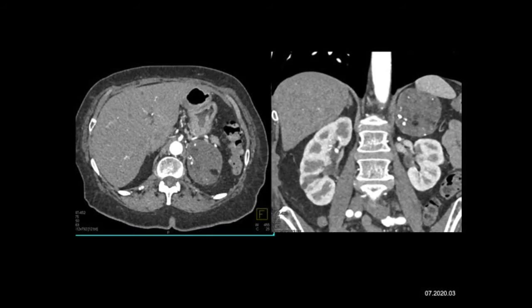They're low density. Adenomas typically are under 10 Hounsfield units and can be minus 10, but they don't have solid fat. That's what we see with myelolipomas. Yes, I know that occasionally metastasis, pheochromocytoma, or a primary adrenal cortical carcinoma has been reported to contain fat, but the tumors then are large, there's irregular enhancement, and usually the fat is related to invasion of the periadrenal or perirenal fat.